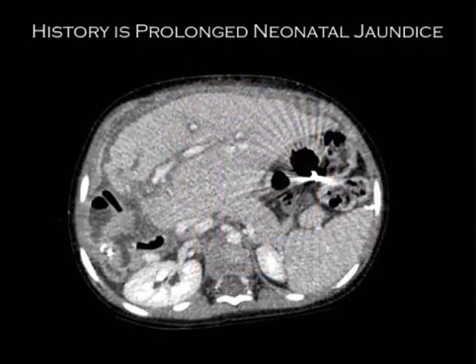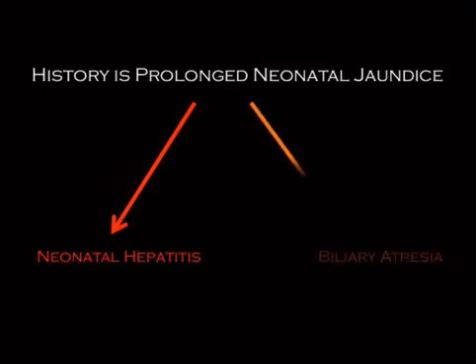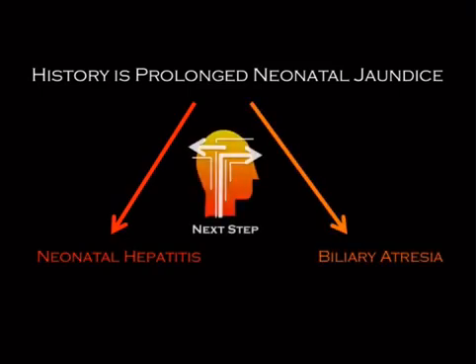All right, next case here. So we got a history of prolonged neonatal jaundice. So it's our neonatal jaundice case. All right, so anytime you got that history, you basically have two choices. You've got hepatitis and you've got biliary atresia. Now, how do you distinguish between those two?